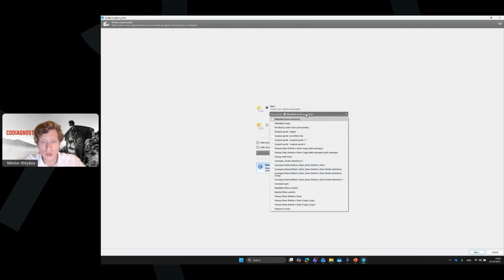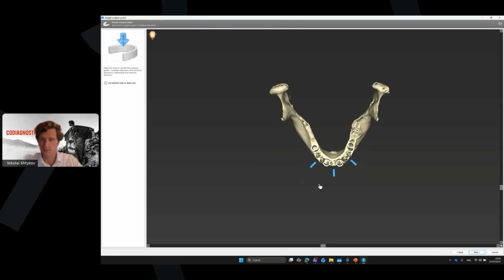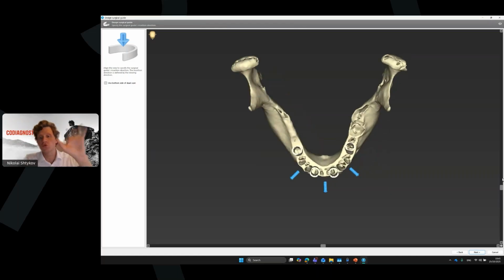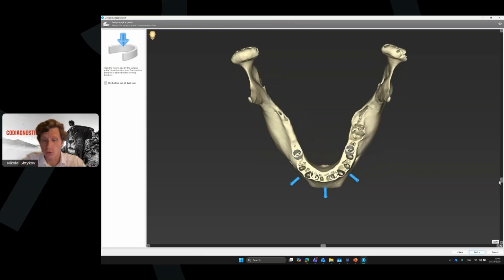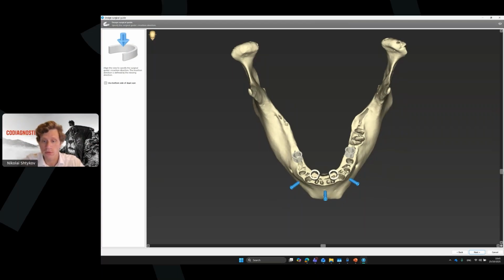So you select the mandible copy here. Yes, that's correct. You choose the cut profile. I have just one cut profile here. And then you need to select the insertion view. I prefer to make it a little bit vestibular, because here it will be a bone support case, and the bone reduction line will be close to the bone. There will be fewer undercuts.